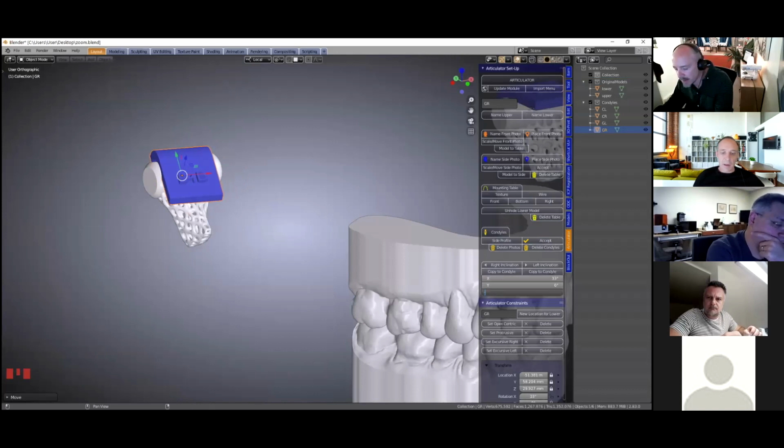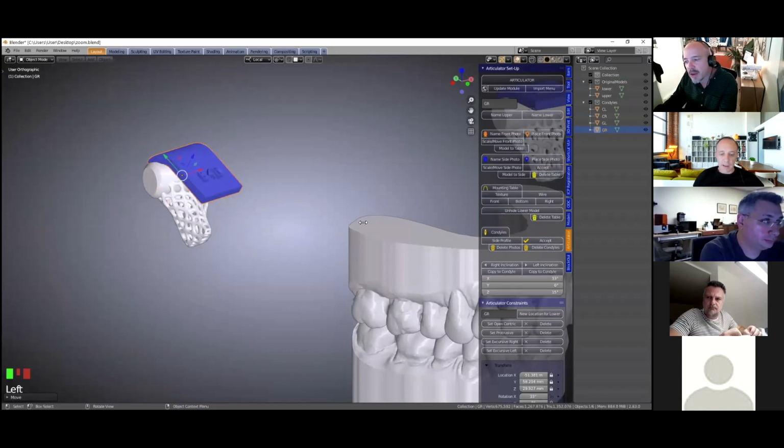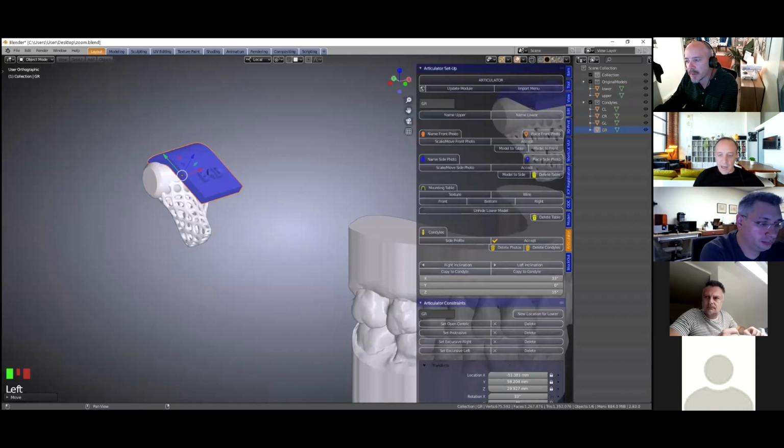Okay, Michael, can you expand your window a little bit for the menu, if that's okay? Yeah, like this. I'll show you a sign. Just hold on. Did you get it?